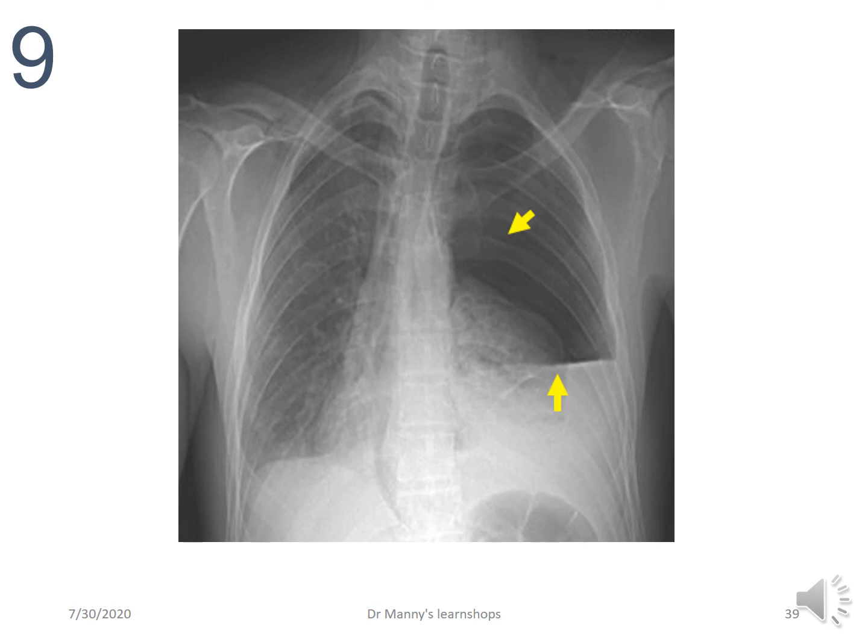And this is a combination again of radiolucency and radio-opaque anomalies. Just for interest, for your point of view. So what you've got there is left upper lobe, very black compared to the right upper lobe. Left lower lobe, very white compared to the right lower lobe and middle lobe.